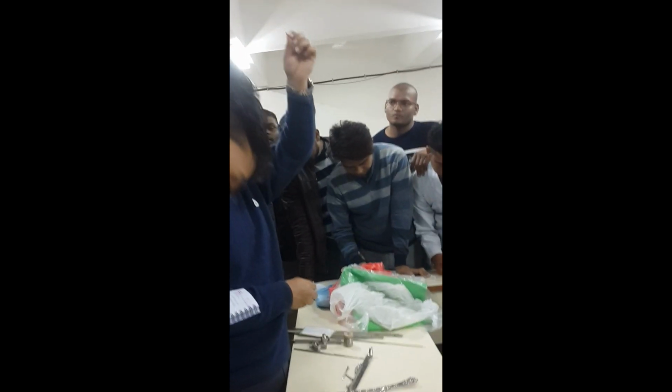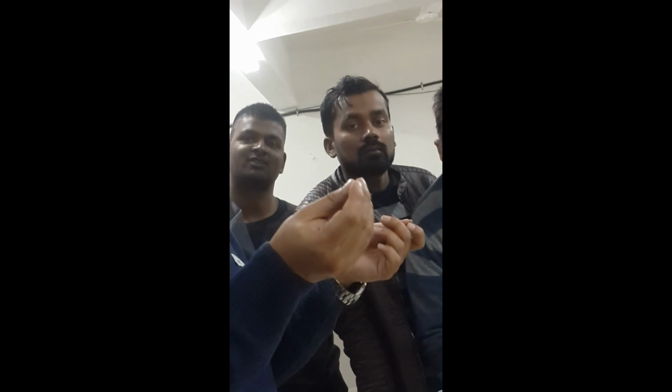And this is a washer. You mainly use it for the malleolus screw and this CCS. You use it because you are applying the screw in metaphyseal bone, which is very spongy. You don't feel the compression, so you have a tendency to keep on going, and the screw goes inside the bone. To restrict that, you have a washer. It's just to hold it like this.